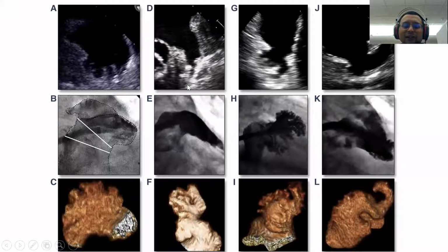Remember the four different types? Yeah. Cactus, cauliflower, windsock, and chicken wing. So this is windsock. Okay, this one. Cactus. Okay, this one is cactus. Chicken wing. Yeah, this is. It doesn't look like chicken wing. I know, exactly. So this is chicken wing. So you're right, that one is cauliflower.